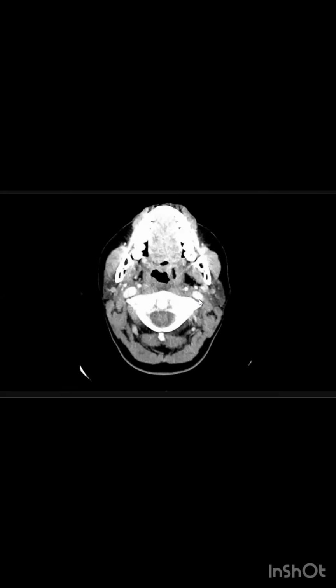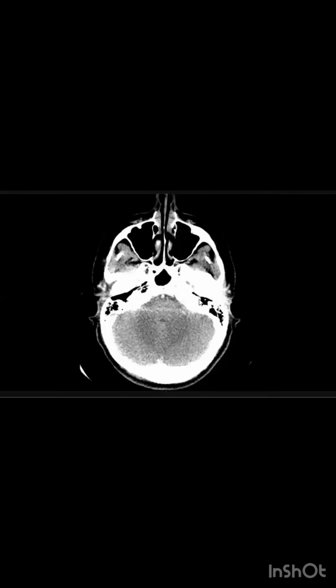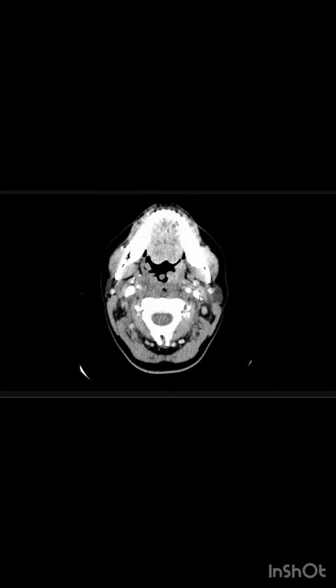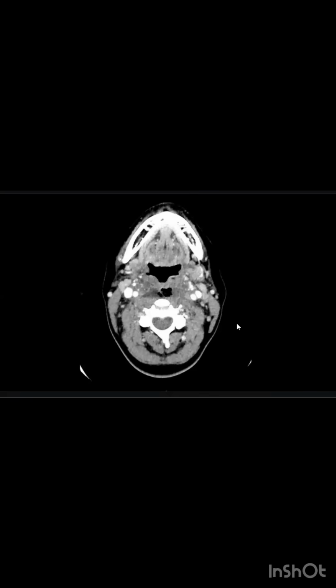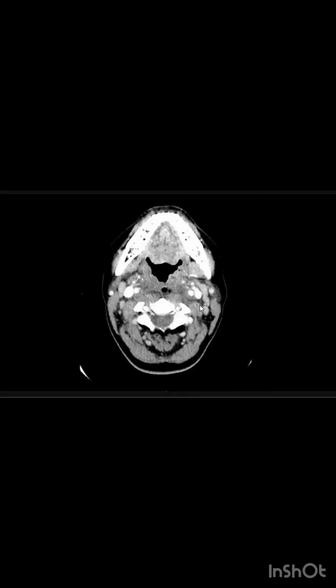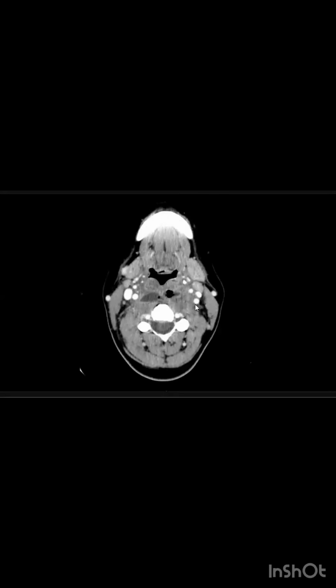Next candidate, your case is straightforward. I think we saw neck infection today in more cases, which are common exam cases, by the way. Maybe retropharyngeal or prevertebral abscesses, and there are gas loculi here, and there is a peripherally enhancing collection extending medial to the carotid space down here.